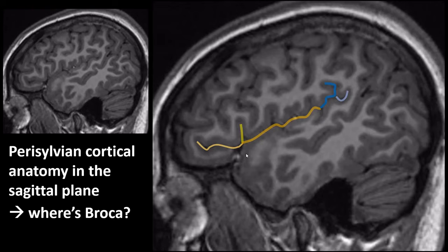I'm just showing you those because recognizing these branches will help you recognize some anatomical structures. More specifically, the inferior frontal gyrus, which is situated along the anterior and the ascending branch. Because of that, it has a configuration that looks like the letter M. So look for the letter M on sagittal images, and you have to scroll a bit laterally to see it because this is located along the lateral surface. Then, by knowing our anatomy, we have now found the inferior frontal gyrus.